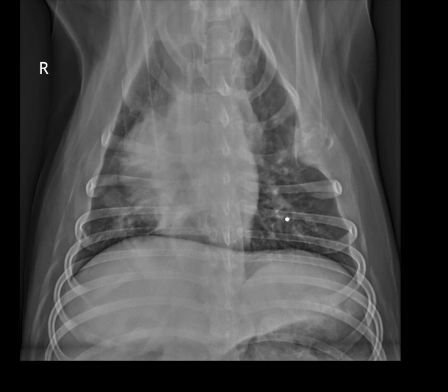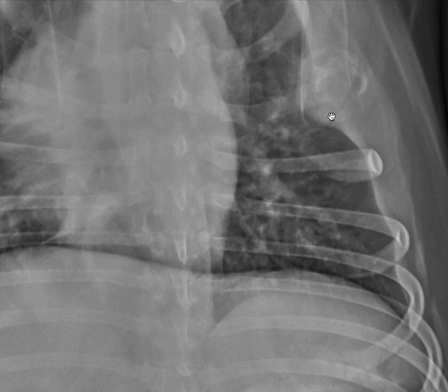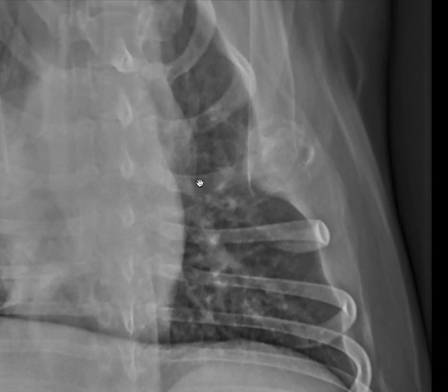When I look in a little more closely, it's apparent that there's interruption of this rib, the left fourth rib, and that there's an expansile lesion creating a periosteal reaction and bone lysis. This feature is highly consistent with a neoplasm of the rib, especially given patient age.